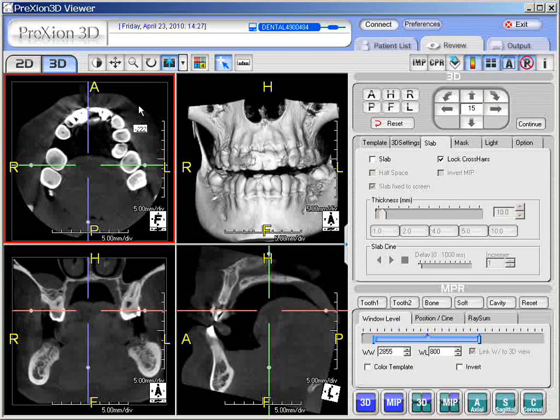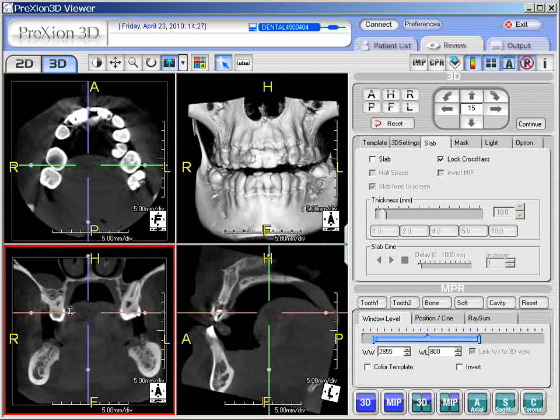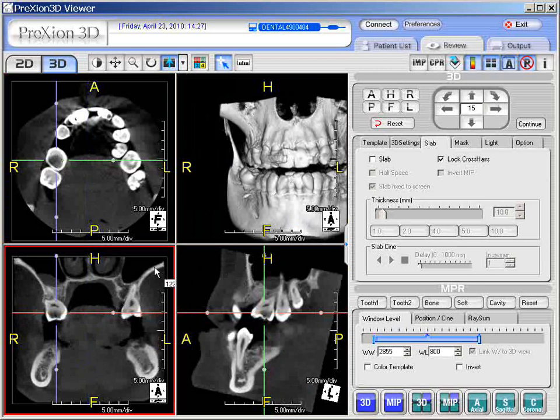Now, one can select areas to evaluate. For instance, we've selected this particular region. I'm going to just hold the Alt key down and select this by simply clicking with the caliper, so we have it in all three projections. We can launch one at a time. Let's pick the coronal view. Just going to double click it.